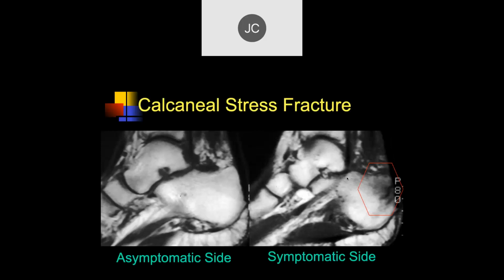This happens to be due probably to the traction of the Achilles insertion. So this isn't the typical heel pain that we're going to be talking about. But this is something you also look for, which is the less common stress fracture at the Achilles insertion.